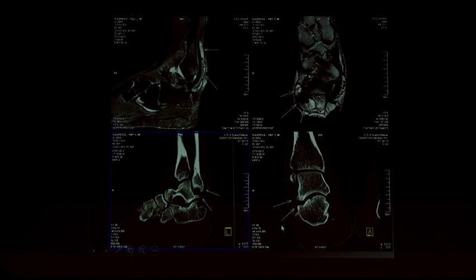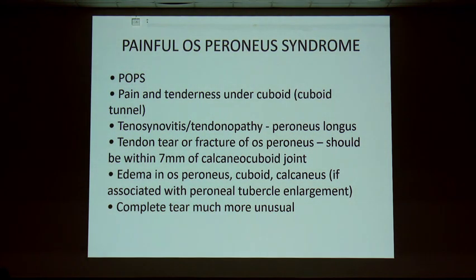And especially when we are dealing with rheumatoid arthritis, there are bone marrow changes, and you can see the bony ossifications as well as projections. You can see it is producing a compression effect over the peroneus longus and brevis tendon. Again, the lateral malleolus going for tear with tenosynovitis. So these are the things we should look for.